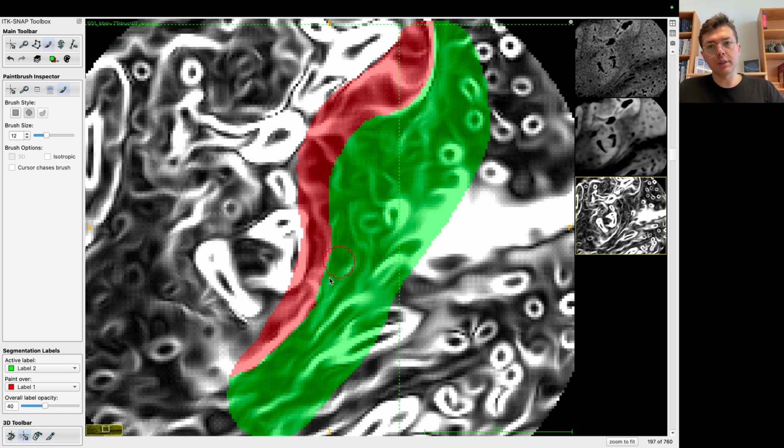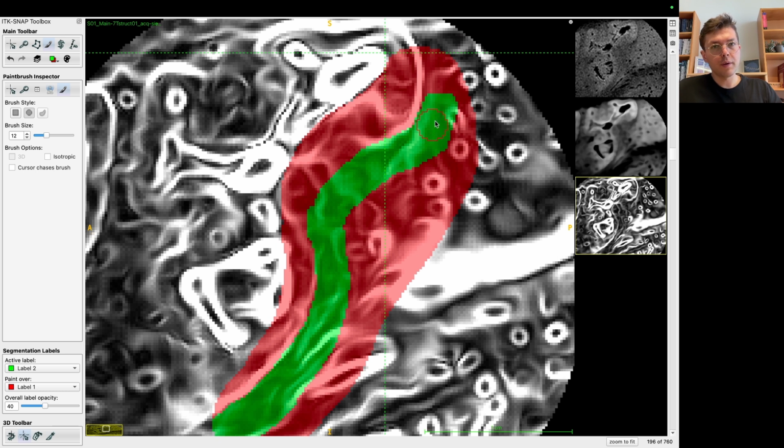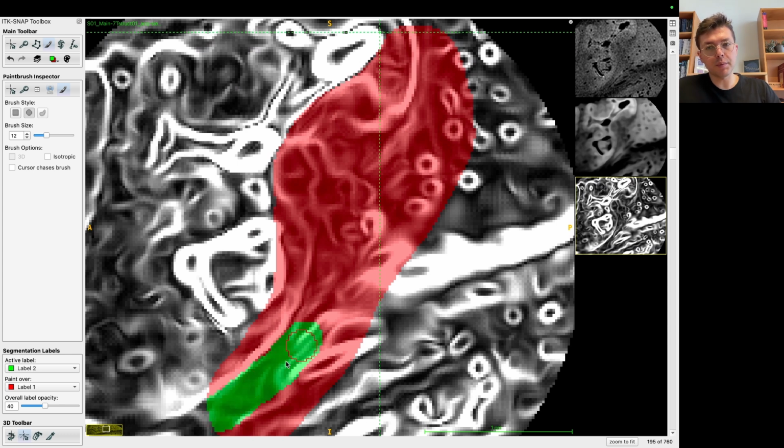We will support this claim based on other publicly available histology datasets, like Big Brain. We can have a look at the AHEAD dataset that I have experience with, with multiple different contrasts. That will come later as almost a control analysis that we can establish based on the in vivo data details that we pick up here.